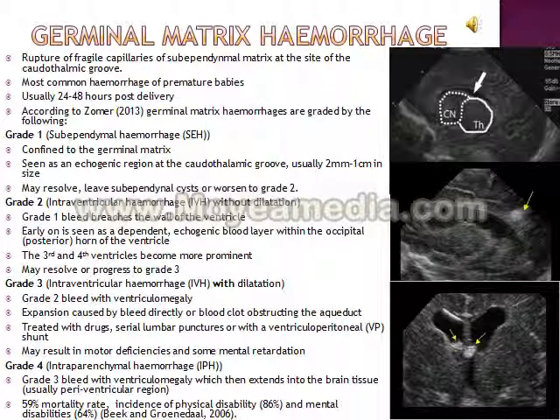1 to 2 weeks post-hemorrhage, the centre will become anechoic as the clot resorbs. 2 to 4 weeks post-bleed, the edges become well demarcated as the clot retracts. By 2 to 3 months post-bleed, it appears completely anechoic as a result of necrosis. Porencephalic cysts may remain.